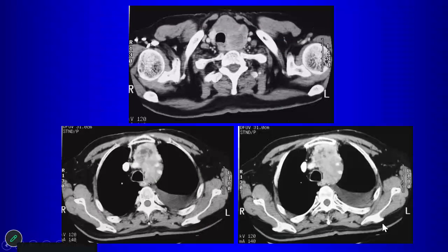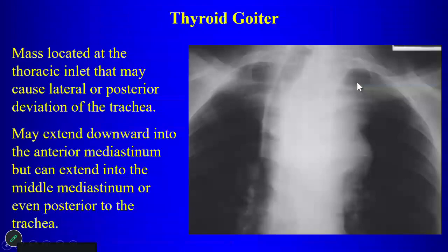Other things that might worry you is a pleural effusion, so what's going on there. But in this case, the mass is encasing the vessels, not pushing them aside. So here, what do you think this is going to be? Like a malignant thyroid mass. So here you, again, it connects to the thyroid, so it is a mass of thyroid origin. So here you're thinking malignancy, all right? So here you have to be suspicious about thyroid cancer.